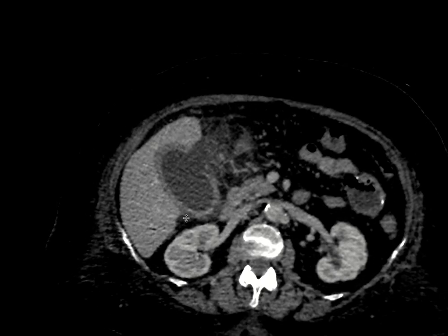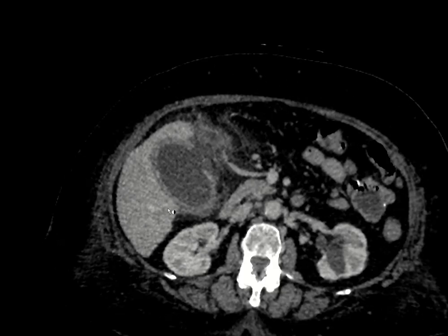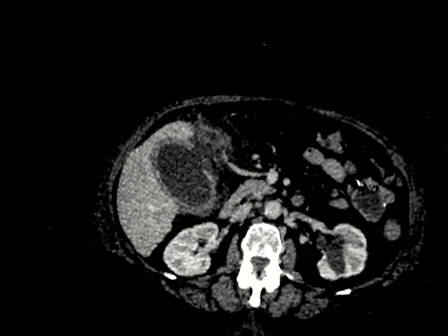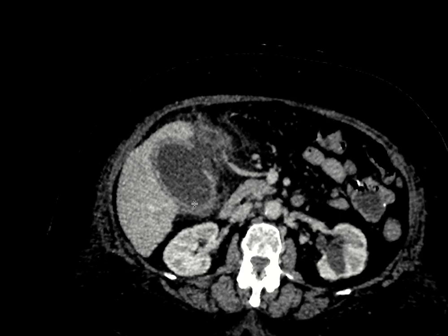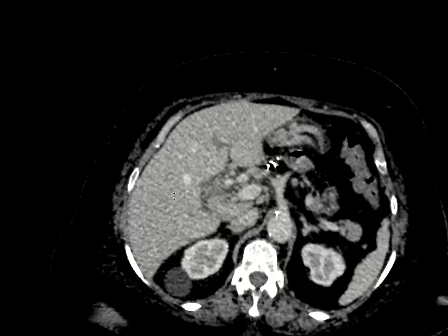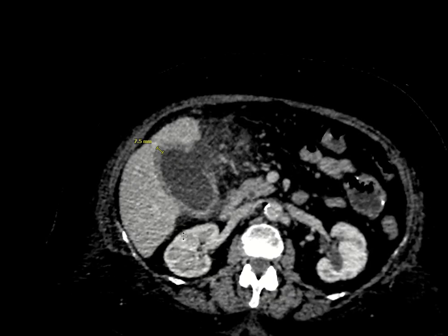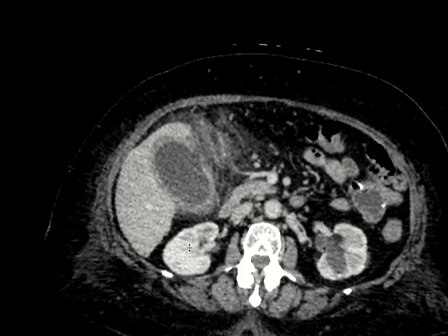Another thing you can look at as well, and you can't see it that well in this particular patient, maybe subtle, but there's a little bit of hyperemia in the liver surrounding the gallbladder, which you can see from the inflammation from the gallbladder can recruit blood supply into the adjacent liver and give you kind of a rim sign of enhancement within the liver. So that's another sign to look for.